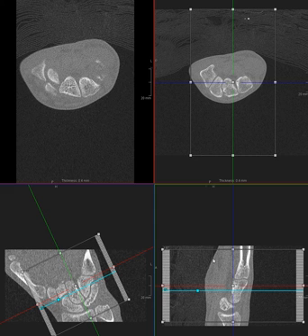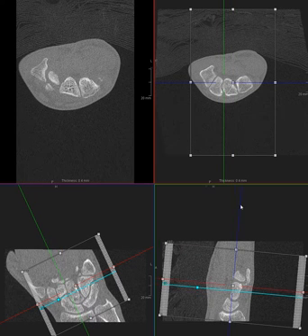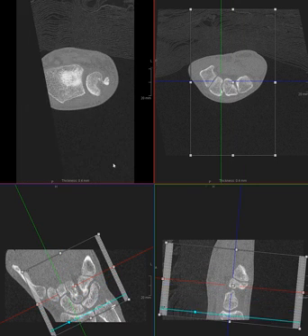And similarly on a sagittal image, it might be something like that. And then you'd get true coronal, sagittal, and axial images. But the scaphoid has an unusual configuration. It's this structure here. It's sort of comma shaped and it's angled, and surgeons are looking for the morphology of the bone itself to determine if something is healing properly or if there are fractures.